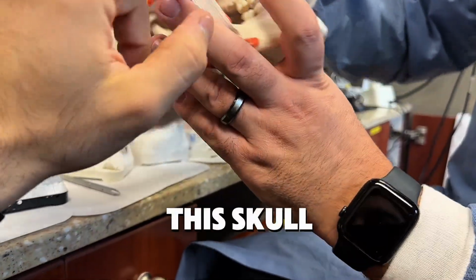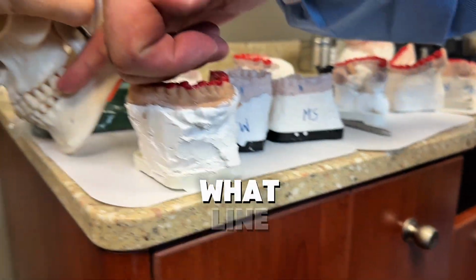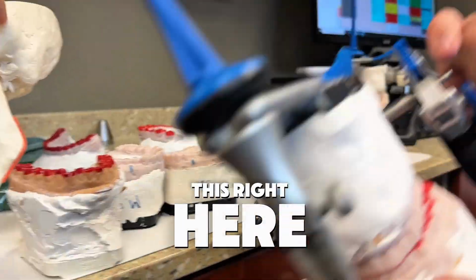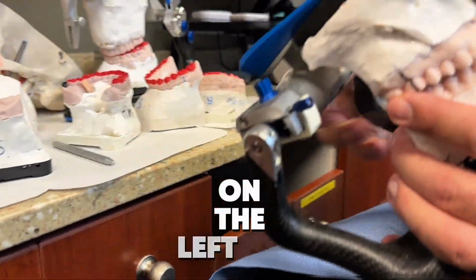Now on this skull, where do you measure this angle? 45 degrees? You're saying it's steeper. What line do you measure with? Basically, this right here is this right here. That's the articulator.